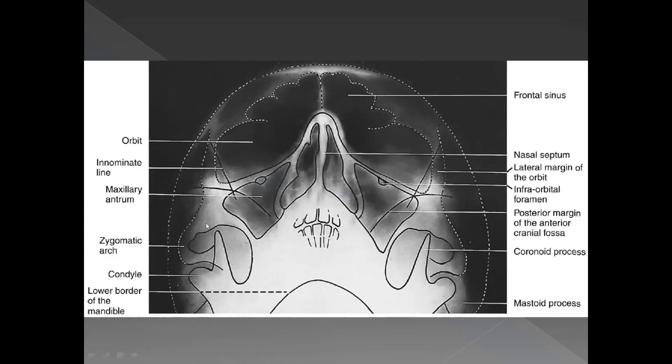You can see the zygomatic arch quite clearly, but other than the coronoid, you might be able to see the condyle. But look at this area over here. This is just a huge white blob. Basically, you can't really make out what structures are present here, because the X-ray has been fired actually through this area over here. So you won't see the mandible very clearly in the 30-degree view.